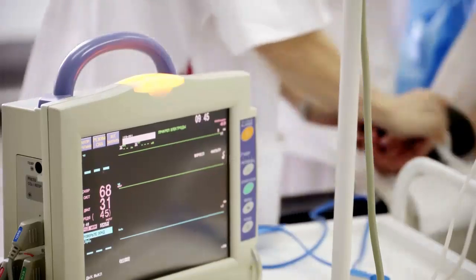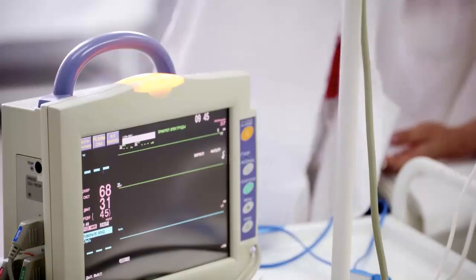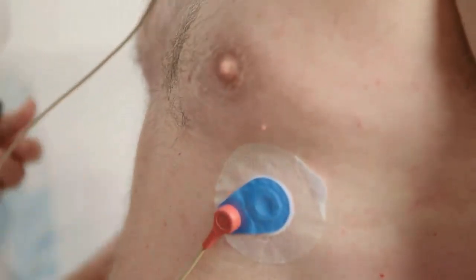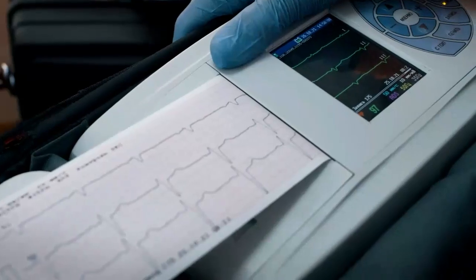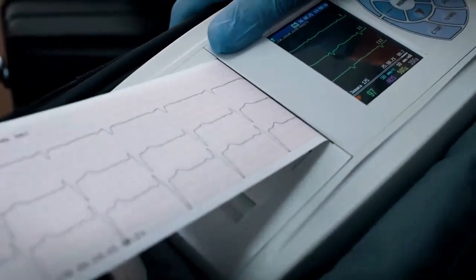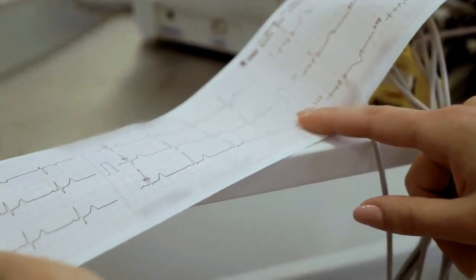To analyze the patient's rhythm, you should clearly understand the EKG strip paper, which we will review in this section. You are a nurse or a doctor, and you have applied electrode leads to a patient and printed out the result on an EKG strip sheet. You have seen the EKG recording of the patient's heart electrical signal condition. How would you interpret the patient's heart symptoms?